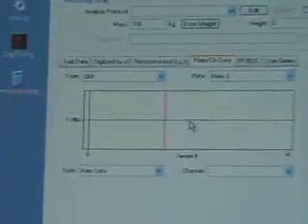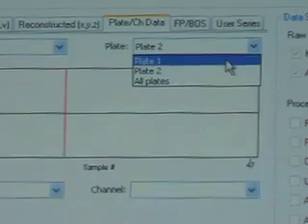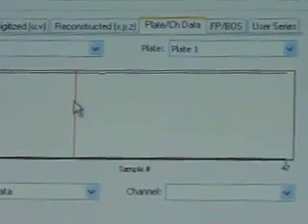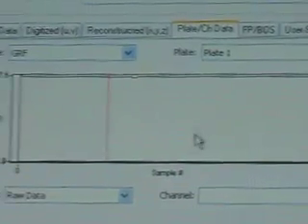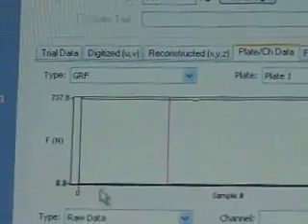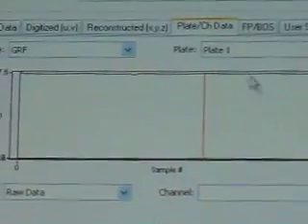Plate one goes up to 737. Yeah, it's up there, of course. There is data here. The second one doesn't have data, but the first one has the FZ here. FX and FY are all zeros here, so that's why. And then you click apply.